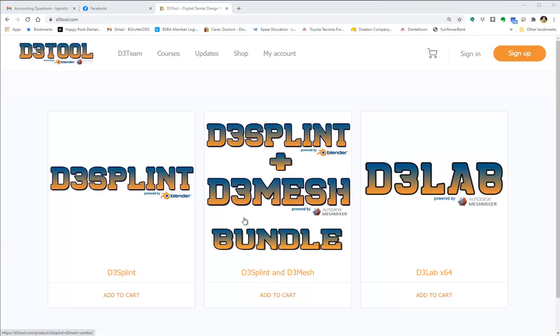In this series of videos, I'm going to talk about D3Splint. It is a software utility that I use for making my occlusal guards. I've made some videos in the past, but I'm going to try to make a quick series of videos that discusses the basics of the software, along with a few different videos on specific types of splint design. And maybe a couple other videos, we'll see.